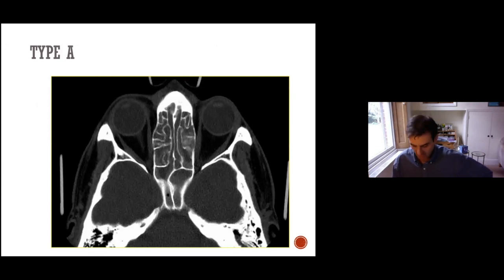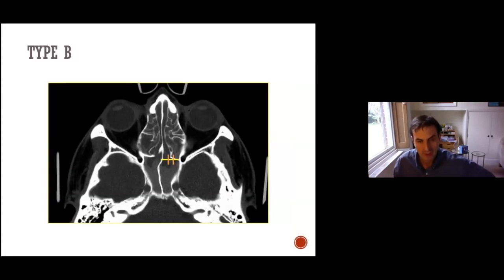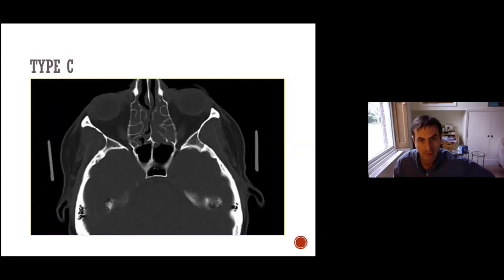So how that looks, well, if you divide up the face of the sphenoid into thirds, like so, then you can see in this example here, the superior turbinate attachment is here, and you've got the sphenoid ostium here. So in this circumstance, coming back alongside the septum with your endoscope and your instruments to approach the sphenoid, it lends itself to a transnasal approach. Here you've got a type B attachment, and you can see this is in the middle third here, with quite a wide space here. So again, you probably favour a transnasal approach here.